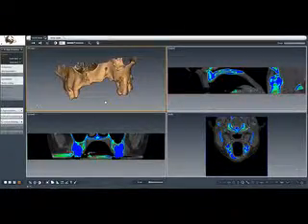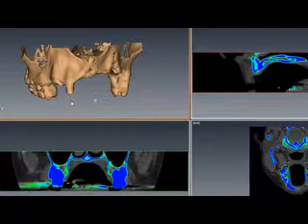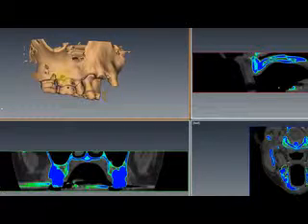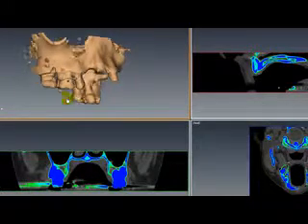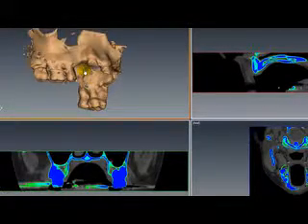This is the treatment plan for case 303, loading the DICOM data and rendering it 3D. Here we go, looking at the maxillary area that was cropped. So looking at the right side in here, as you can see right here, 2, 3, 4 area, it looks like we have bone there. As we go to number 5 area and then number 6, we have a major defect.